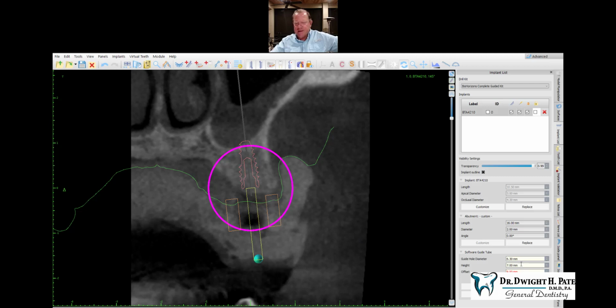Well, if I know that my offset, which is the top part of this line, is at 9 millimeters, and the stop is, because this sleeve is 7 millimeters tall, 6 millimeters down into the sleeve, then my drilling depth is the offset.